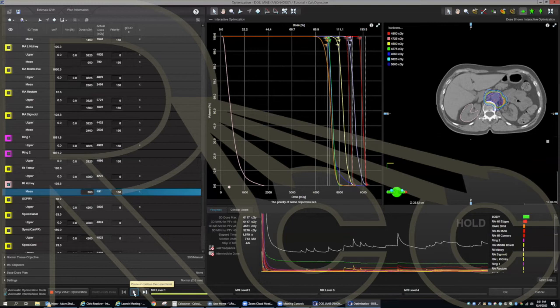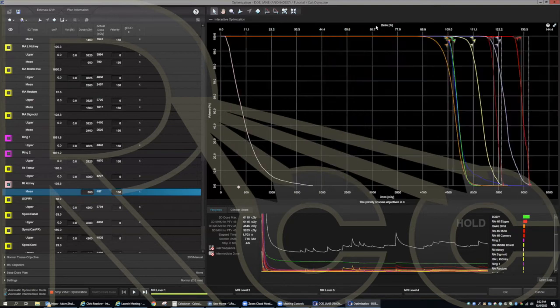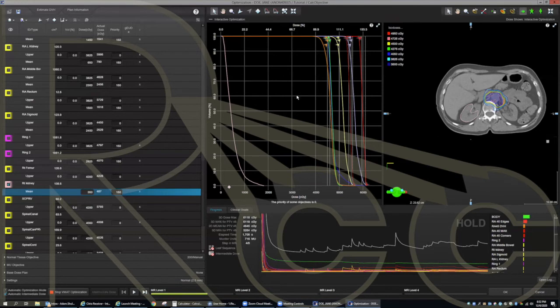You can expand your DVH window so you get rid of that other one. Yeah, if it makes it easier to see your DVH. It does, but to me, my old eyes, I can't read it. I've gotten so used to looking at DVHs as a square. I know what they look like in this view, and when I expand it, now this completely looks worse. Okay.